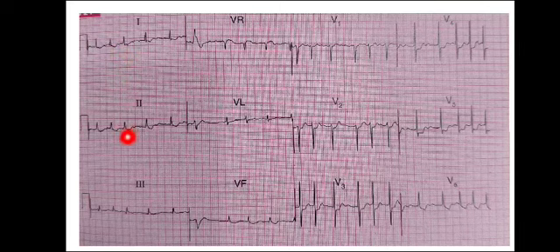Here you can see there is ST segment depression in lead 2. So when you find ST segment depression in lead 2, you try to find whether it is following a vascular pattern or not. तो जो inferior leads आपकी कौन सी हैं, lead 2, 3 और AVF. तो इसके अंदर तो ST सेगमेंट डिप्रेशन मिल रहा है, लेकिन इधर आपको नहीं मिल रहा. ठीक है, this is not following a vascular pattern.